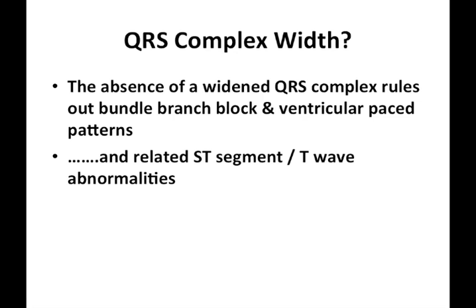So, the absence of a widened QRS complex rules out bundle branch block and ventricular pace pattern. And, as we did with LVH, because we've ruled out these particular patterns, we've ruled out the presence of ST segment and T wave change that are related to these abnormalities.